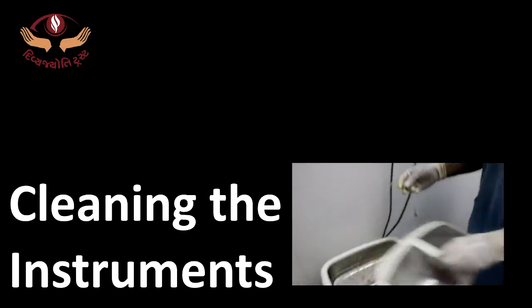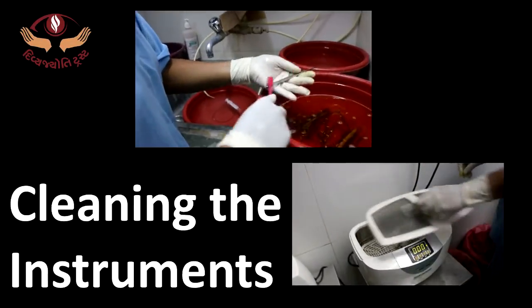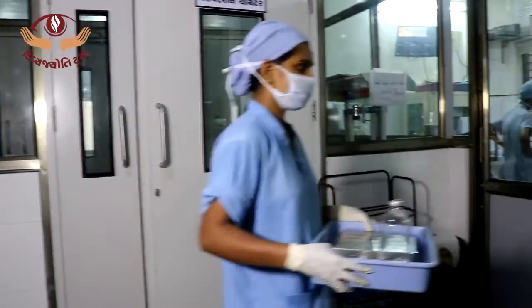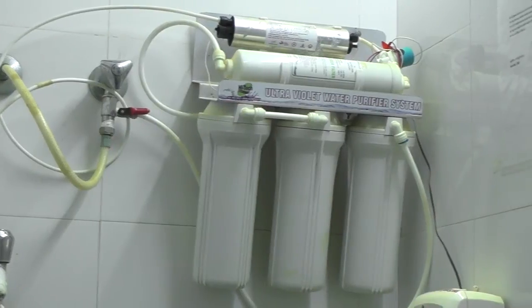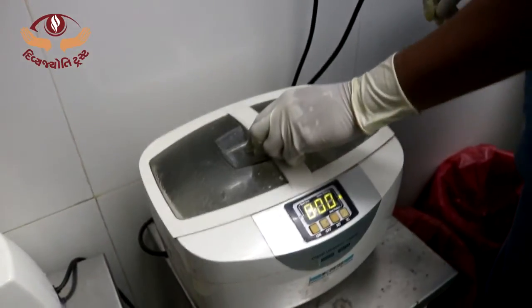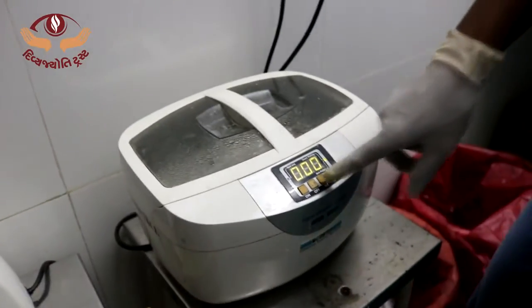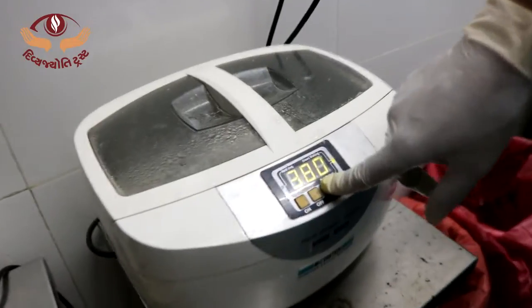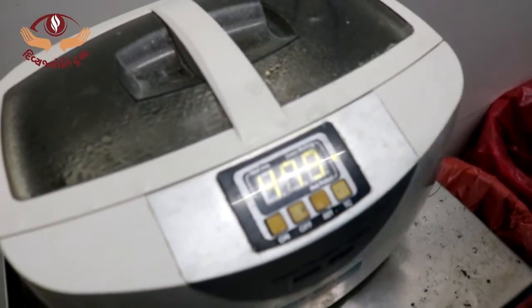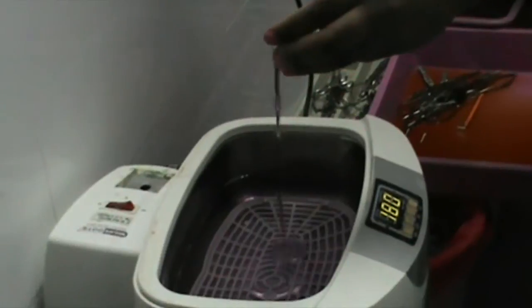Cleaning the instruments. Instruments should be cleaned as soon as possible after the use. Use distilled water only for cleaning purpose. An ultrasonic cleaner can be used for cleaning the instruments. It thoroughly cleans the depths of the cannulas, tubes, and other unreachable parts. An enzyme solution is added to facilitate the cleaning progress, though this is not mandatory.